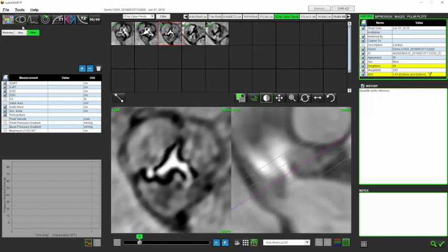And I'm now going to go ahead and planimeter the valve by including the area that is bright white and excluding the black. The black includes a lot of calcified material. We don't want to include that in the valve area. So I'm tracing right along the black. If there's an area where there is no black, we just connect those areas.